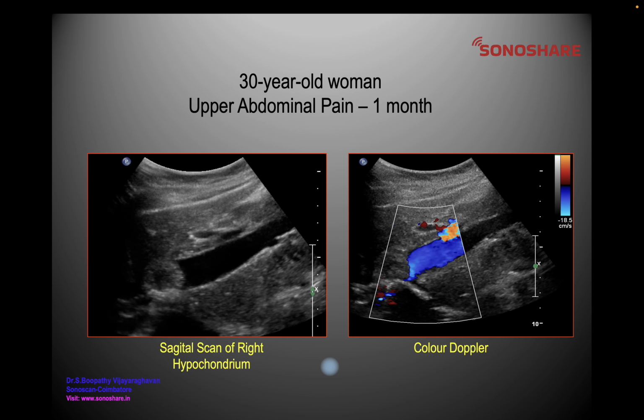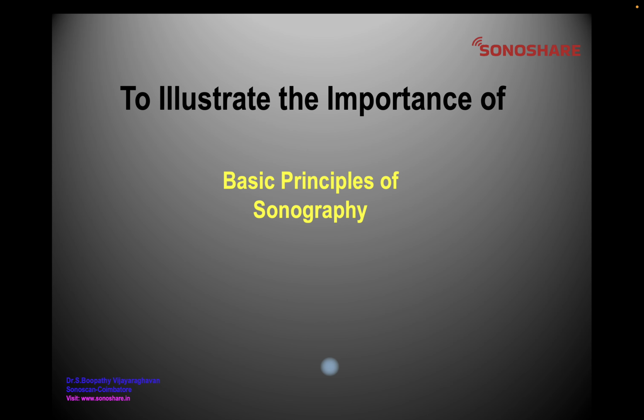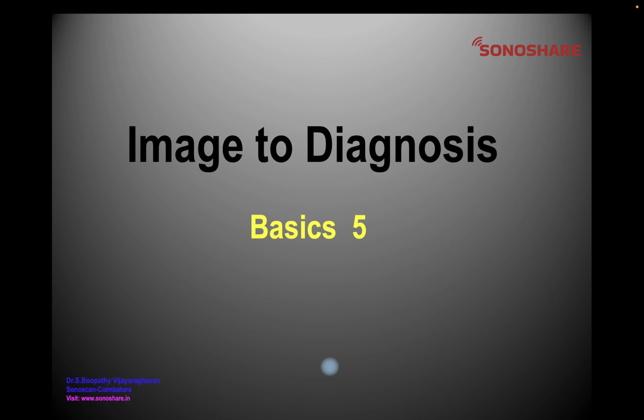Now this is the appearance, and this case is shown to illustrate the importance of basic principles of sonography.